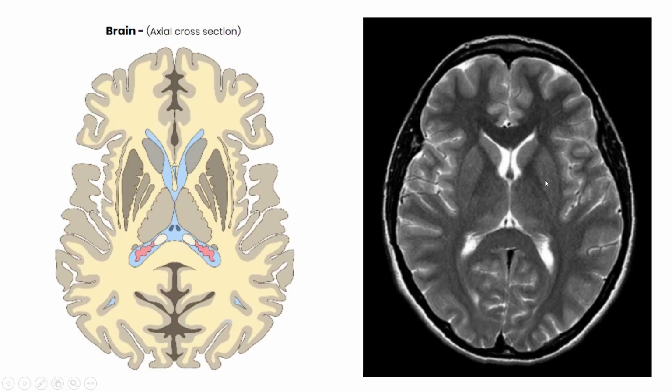So you can see this contrast of this T2 weighted axial image is slightly better than the one that was in the previous slide, and we're able to make out the internal capsule a lot better. We're still not quite as able to see the globus pallidus, and we'll show it to you here in this image, but in a later slide I do have a proton density weighted image that really does define that well. So these are just slightly different levels.